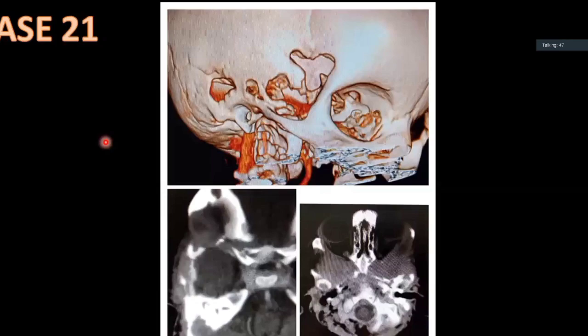Sir, I would like to ask the history of the patient and the age of the patient. Six years, sir. Sir, it appears an aggressive lesion with soft tissue component and having bone defects. I would like to put it in the case of MET, sir.